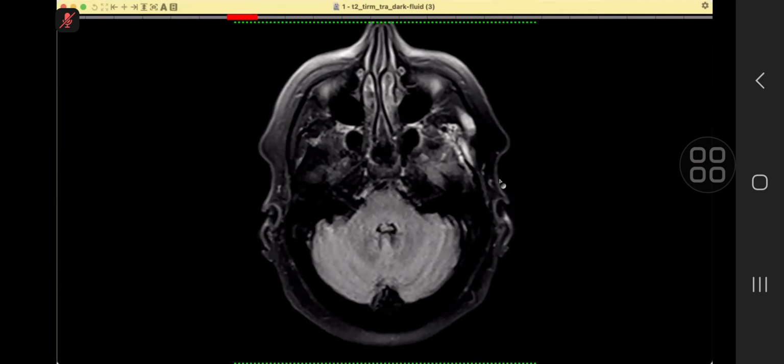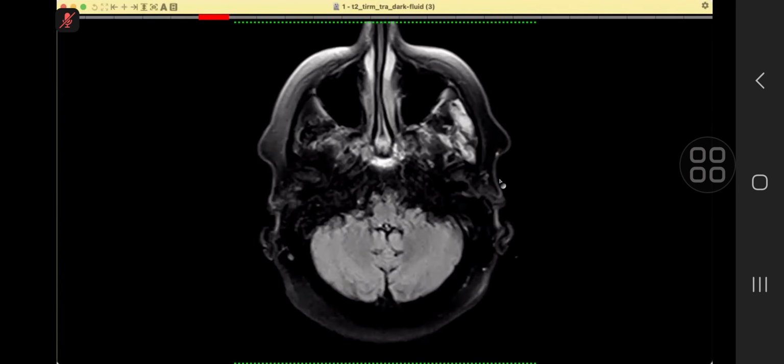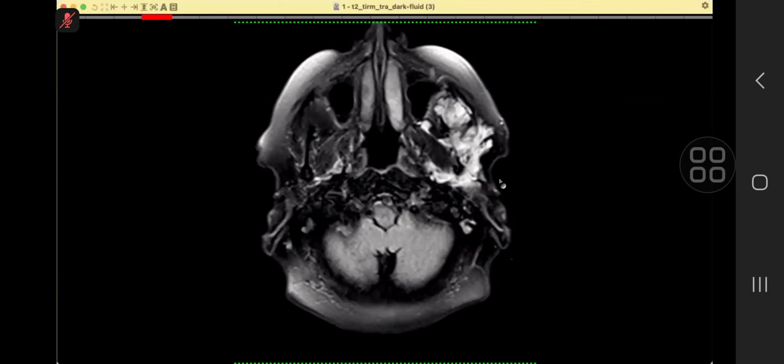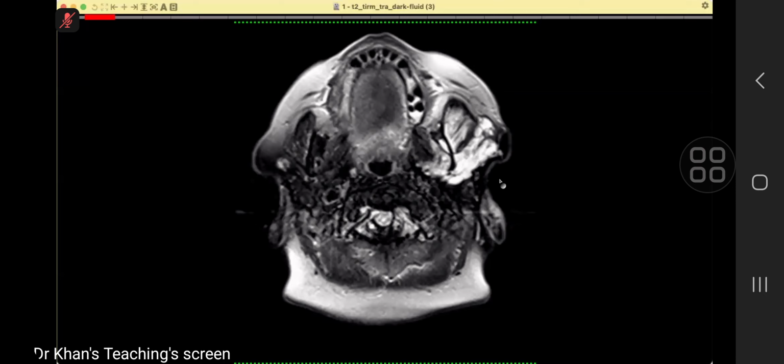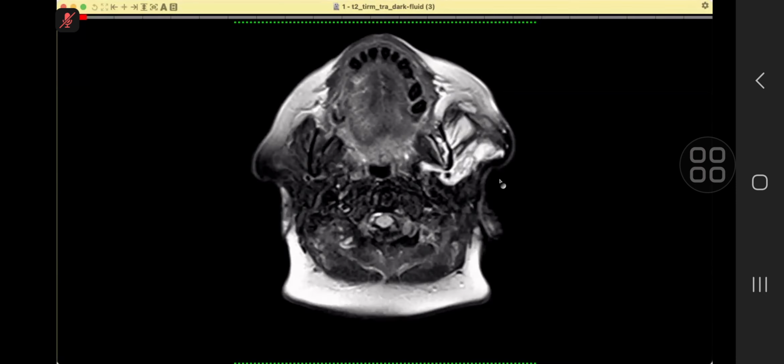Please remember, it is not enhancing, it is high signal. It is high signal, yes. Basically, I said it is enhancing, so I'm just correcting you there. Okay.